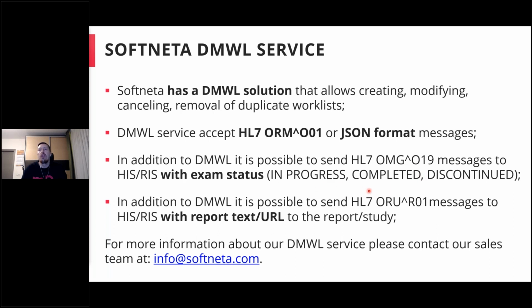And it is also possible for us to send to your HIS system an HL7 ORU message, which would notify the HIS system that the study, the exam, has already arrived to the PACS and is already available for viewing.